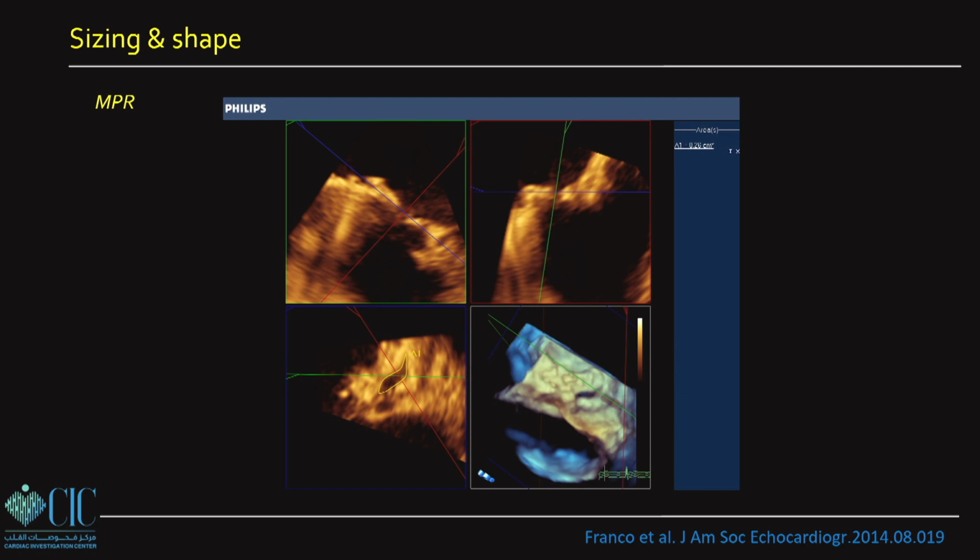Why is that? Two reasons. We said one of them. If we measured on the 3D rendered image, it is liable to gain artifacts, like what we did. Number two is the projection.